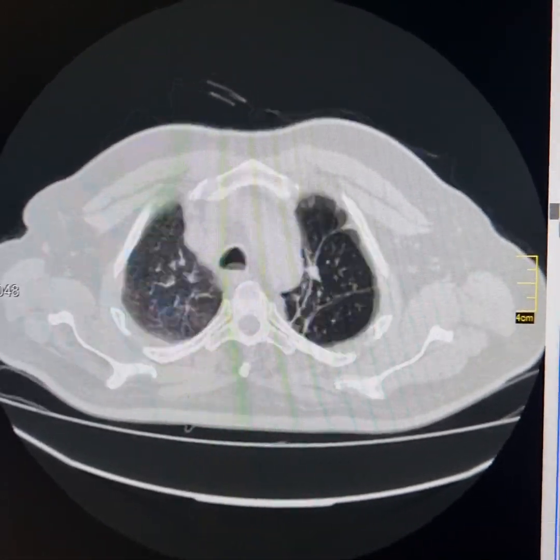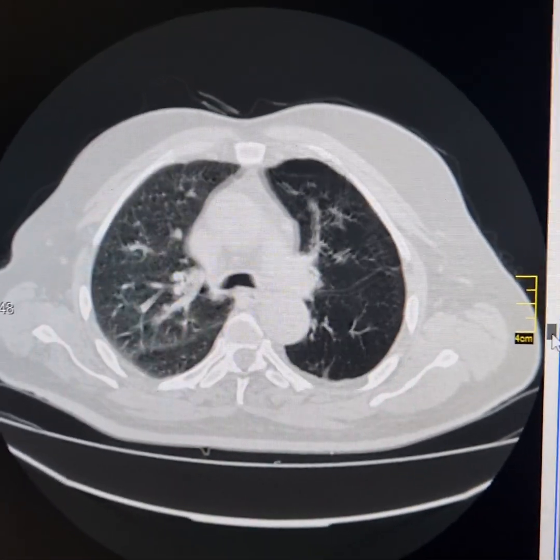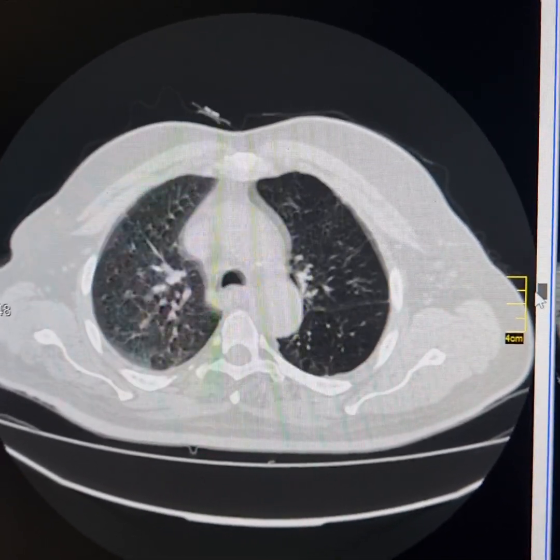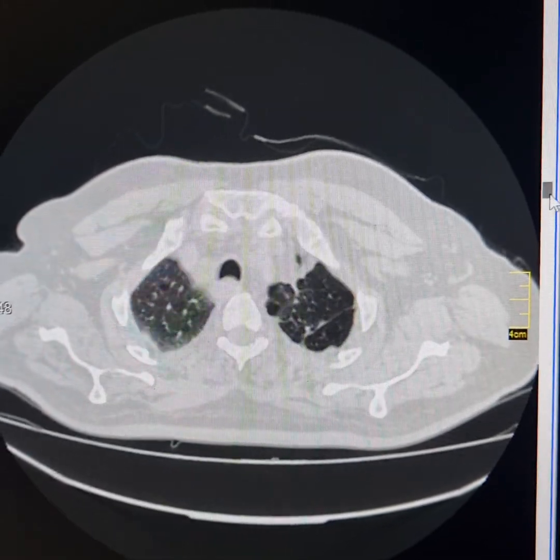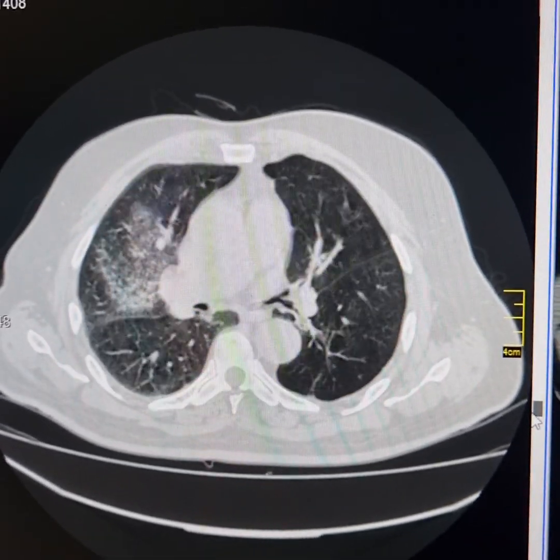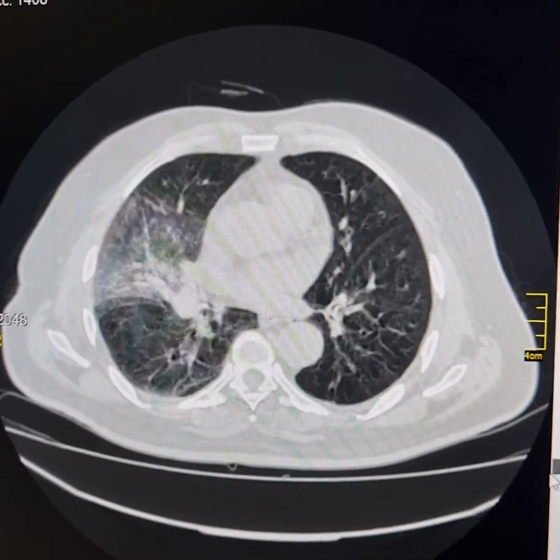Now please observe again the differences in the perfusions of both the lungs, the sizes of the pulmonary arteries and the paucity of blood vessels on the left side. These findings are typical of Macleod syndrome.